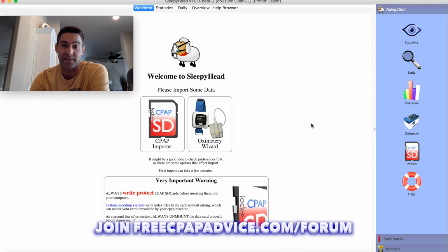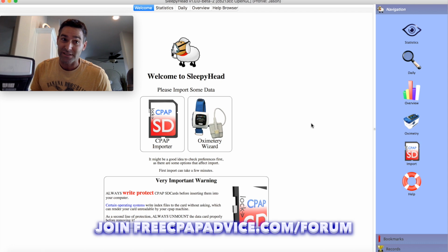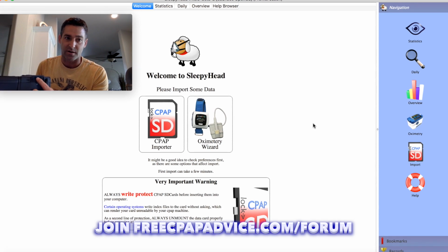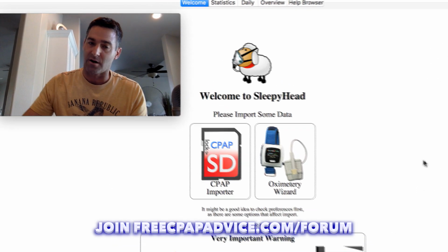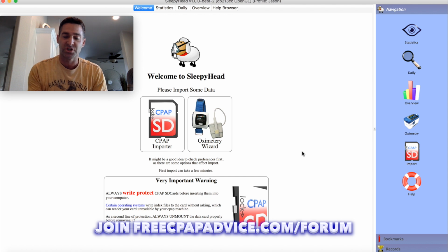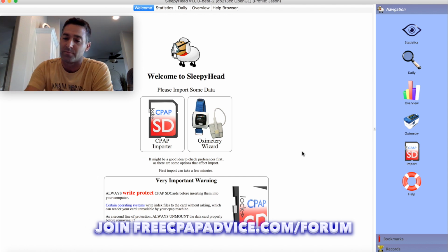So how easy was that? It's already downloaded, it's ready to go. So now what we need is to put some information in there. So from my trusty Philips Respironics System 1, I have on the back my SD card. If you don't know what an SD card is, it's that little guy, okay? I'm going to be shoving this in my computer, and then I'm going to point to it so that it knows where to download it from. If you don't have a card reader on your computer, you can always get one fairly cheap. Sometimes you can use like a camera or a video camera to upload them.